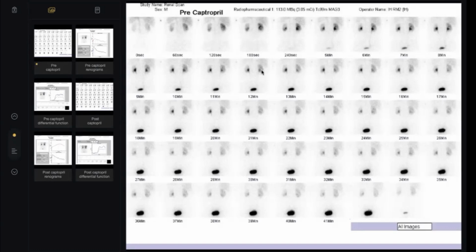A normal excretion is also seen in the bladder, but there is a delayed contrast excretion seen in the last images in the last row at the left kidney and the renal pelvis. One second, my colleague, follow what our brilliant colleague said.